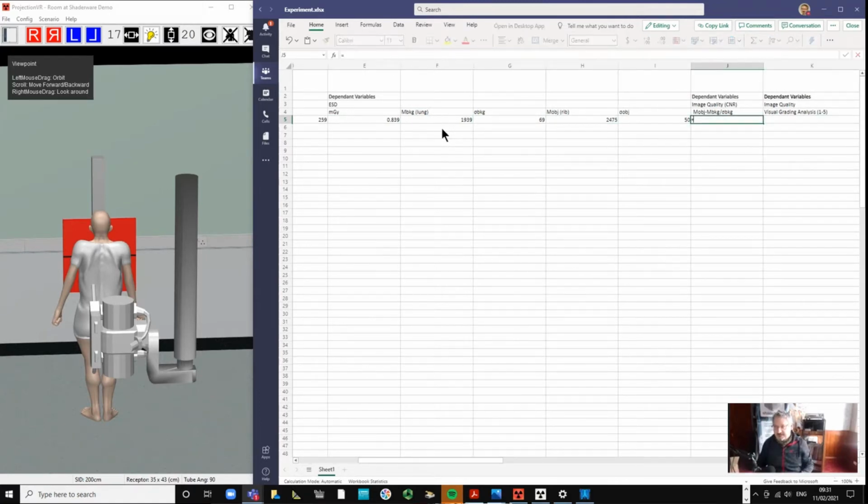I mean, it's relatively easy. You use equals open brackets m_obj minus m background, divided by standard deviation of m background. Oh, I didn't put a bracket in. Put another bracket in there. Yeah, that's good. So that's a ridiculous number of decimal points.